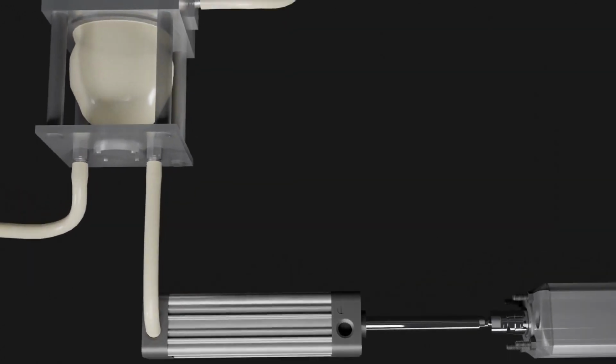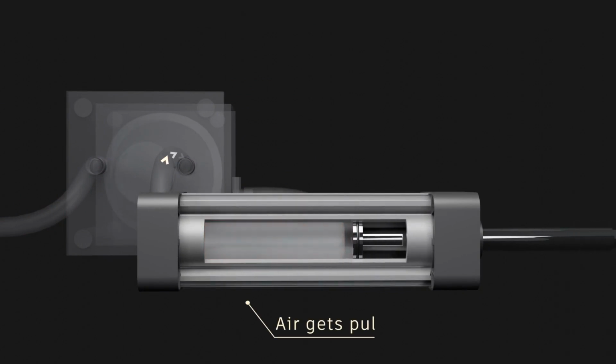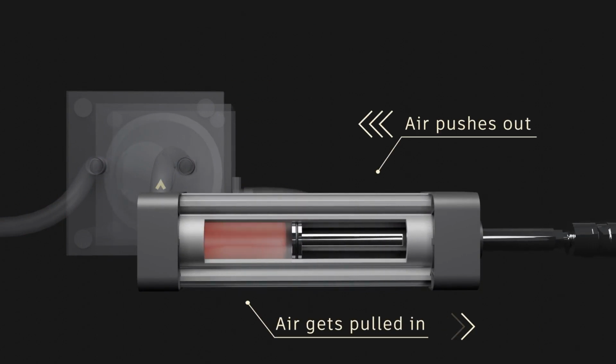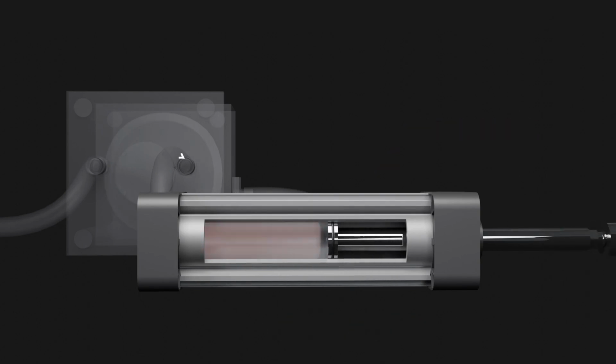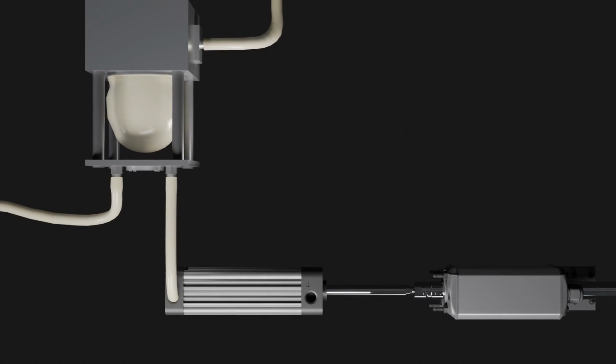By moving the piston, we compress a constant amount of air into a smaller volume. At a constant temperature, we can pressurize the system according to the simplified ideal gas law of P1V1 = P2V2, where the total pressure and volume are equal at different states. The same is done by decompressing the air and depressurizing the system.